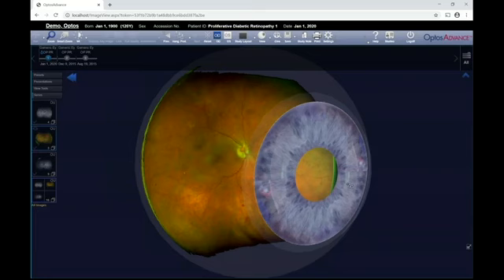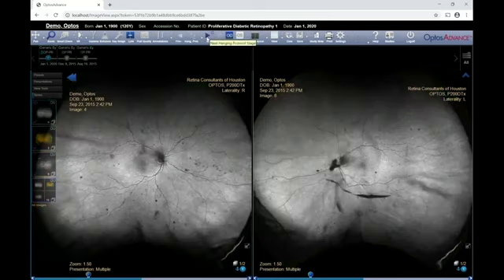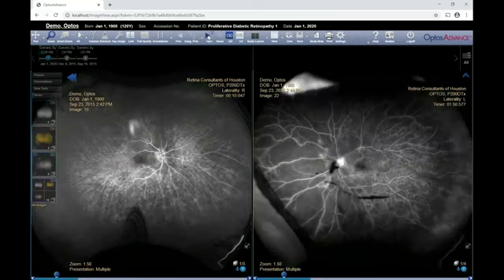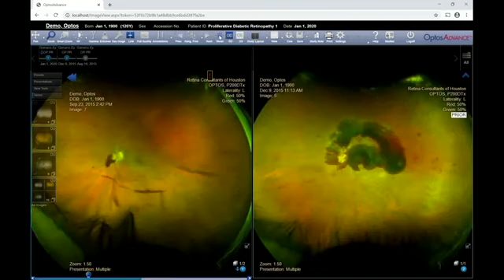If prior images exist, a timeline will be visible on the top left of the screen underneath the toolbar. Pressing the Next button will go through the images taken today first, and then show right eye prior images. This is noted by a red exclamation point indicating multiple studies are present. Today's image will appear in the left viewport, and the most recent prior image will appear in the right viewport, labeled as prior. To see priors for left eye, autofluorescence, etc., continue to press the Next button.